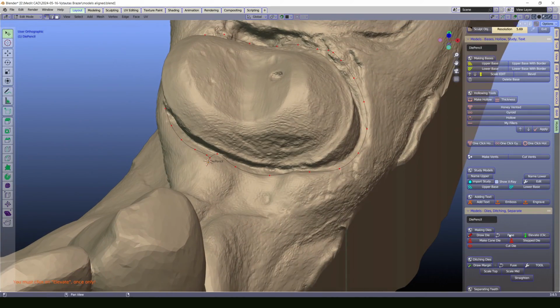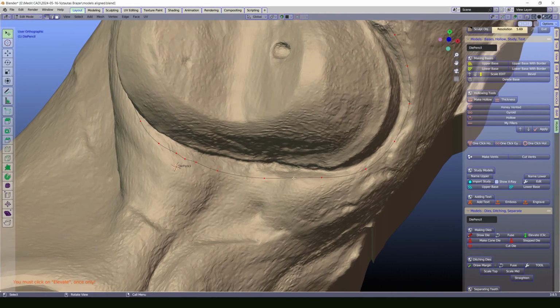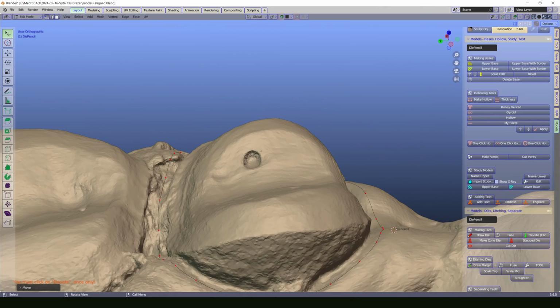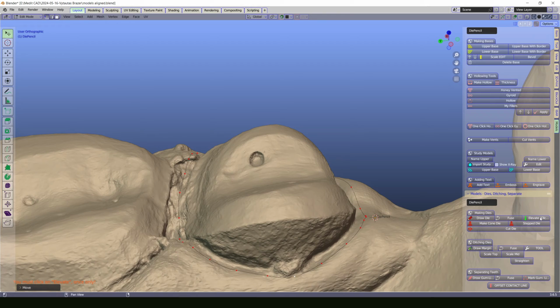So now I choose to fuse it. I make some adjustments like always. I think it should be all right, and let's try to activate the function of making die. First of all, we need to elevate.